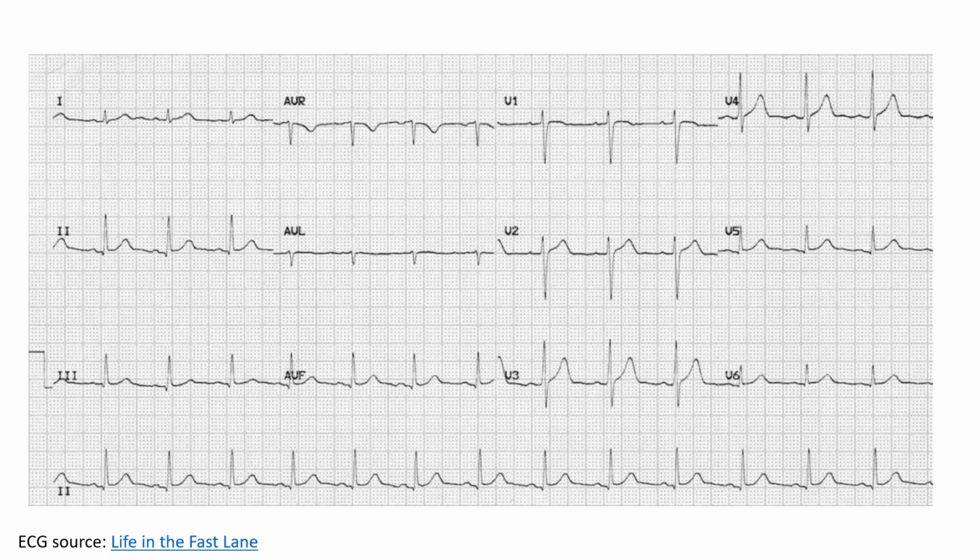Here's an animation showing how I try to do that. Half a second to see the whole thing without focusing, 1.5 seconds to scan the rhythm strips, 1.5 seconds to look at the limb leads, 1.5 seconds to look at the precordial leads. If it's clearly a sinus ECG, this really probably does take 5 seconds. If there are some features that trigger my curiosity, I might take another 5 seconds. Of course, beginners will take longer, but I think this is achievable for you by the end of residency.